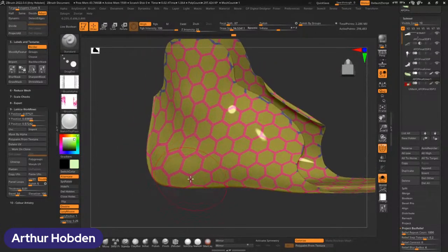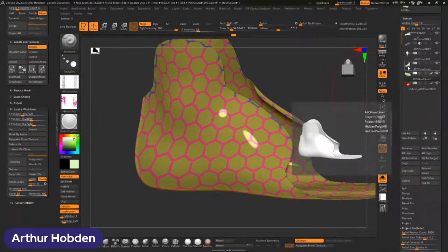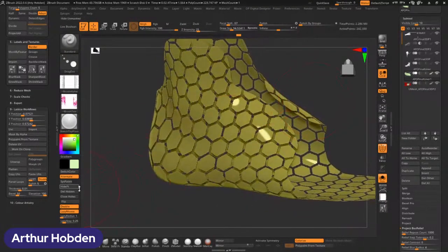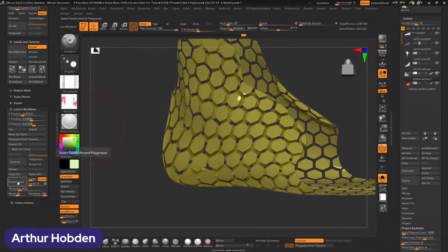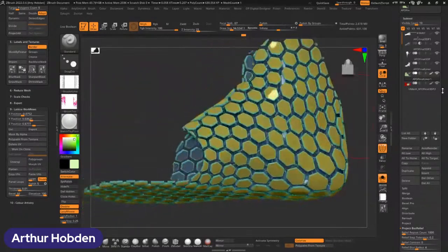And this is really exciting because now we can isolate this group and create that cutting tool again, just like before. So let's Control Shift select this group, and we're going to delete hidden. And now we're going to just maybe polish this once just because that's really pretty jagged. And let's create those panel loops again. So there is our cutting tool. Look how easy that was.